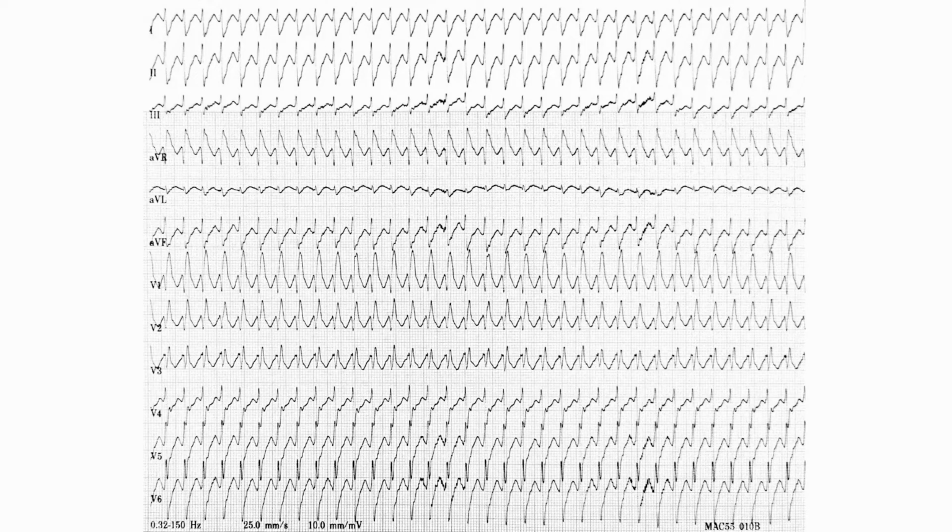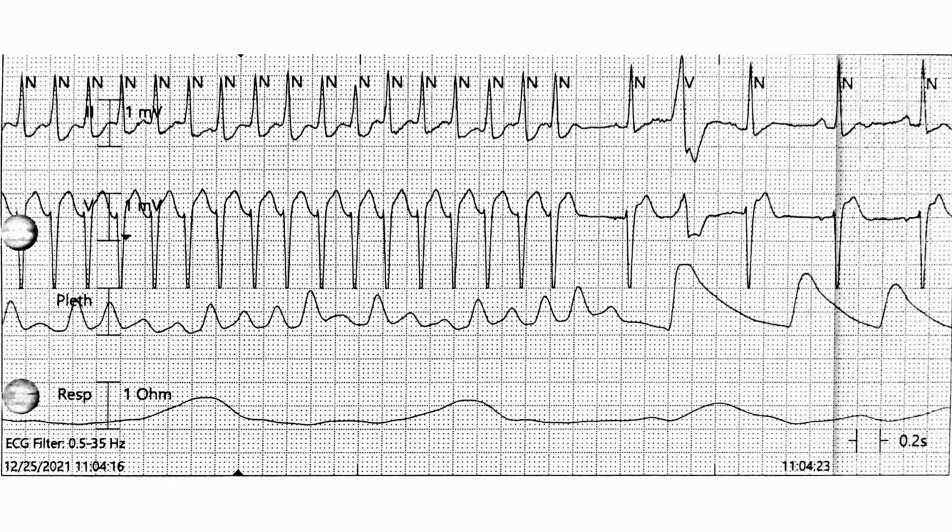Shortly after the tachycardia started, the telemetry nurse noted that the rhythm had changed, that the QRSs looked different, and so they got a 12-lead rhythm strip. This is a few minutes after the initial tracings were recorded. And this is the last rhythm strip that shows the termination.